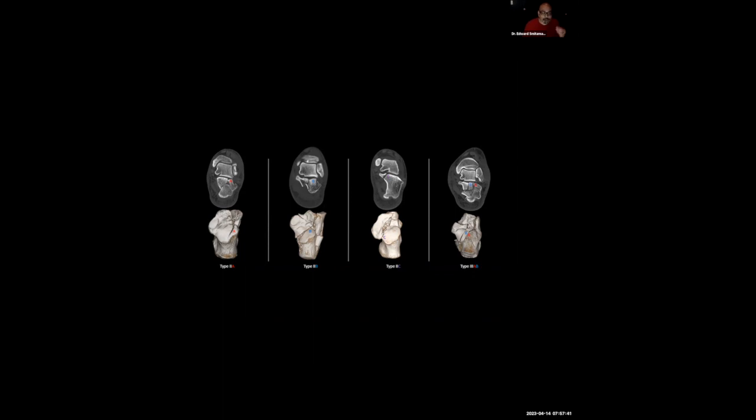Non-displaced fractures are 2 millimeters or less, okay? So you can have a totally comminuted, multi-fragmented fracture of the calcaneus, but if there's no displacement whatsoever, non-displaced, it's going to be called a Sanders type 1, okay? But here I provide some 2s all the way to 3s, okay?